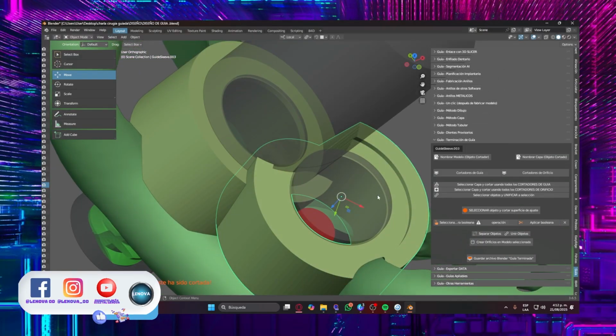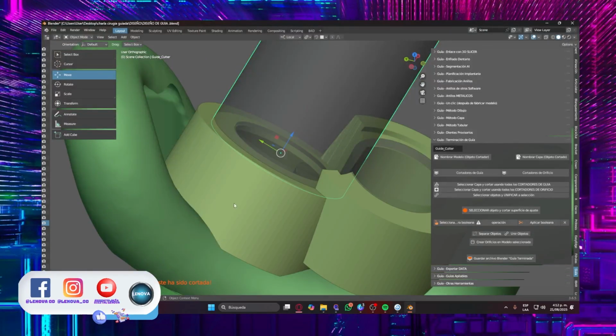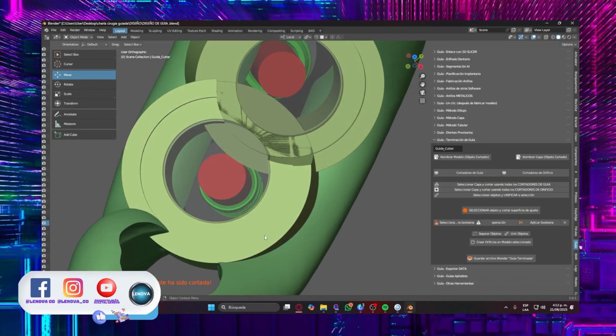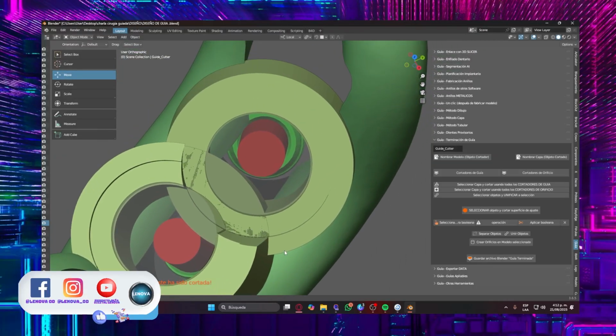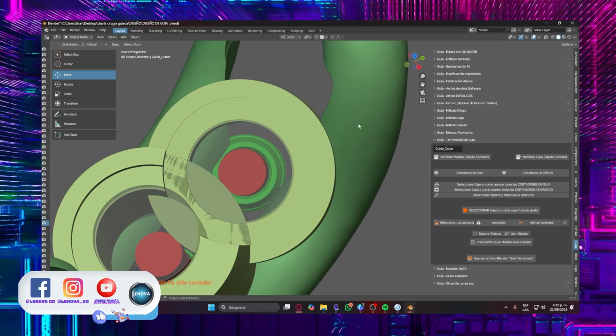I don't need it anymore. No, just kidding. I need to trim here. I select the element here and cut. Look how we're doing. Now it's time to clear the internal area. This is done in all programs, but in Blender, the configuration of the rings is done manually.